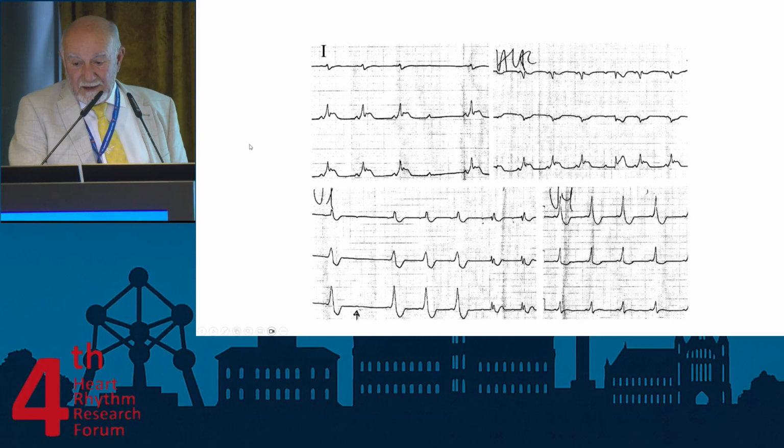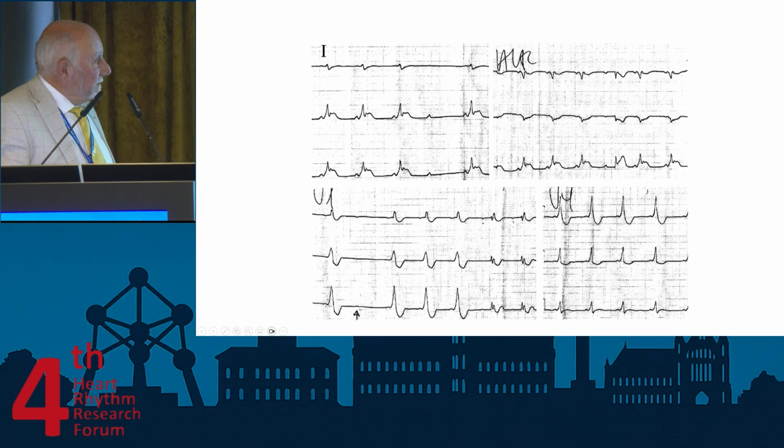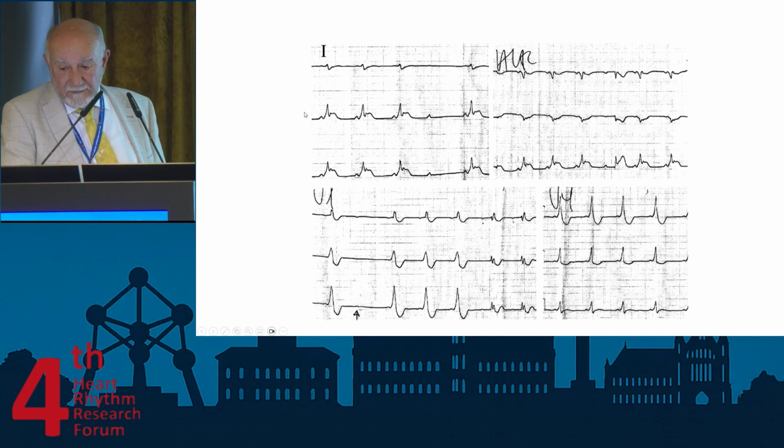Here, we have sinus rhythm very clearly in this slide. 12-lead EKG, a little bit strange. Sinus rhythm, we see a block, P wave, and then the same phenomenon seems to happen here, but we have now a long PR, then a short PR, etc. And look at here, we see a change in the morphology of the QRS complex. We see here a small P wave, but this is a real P wave, okay?